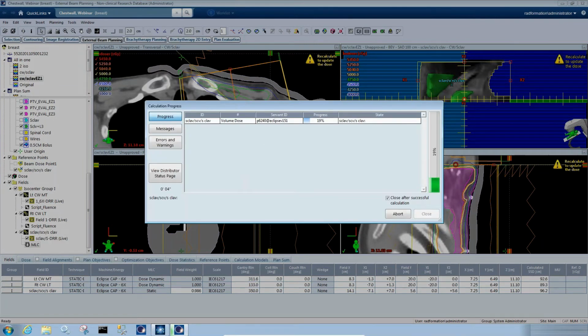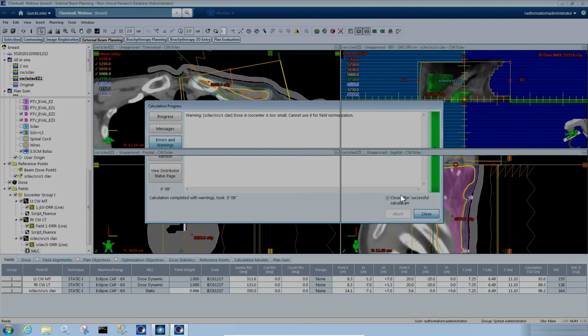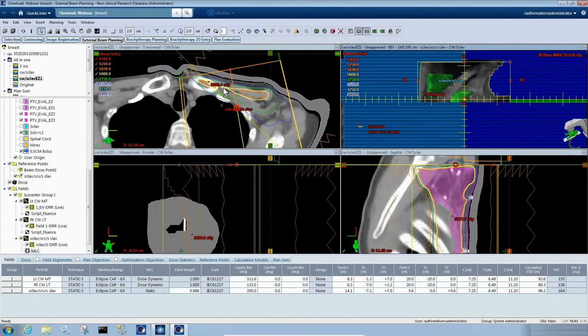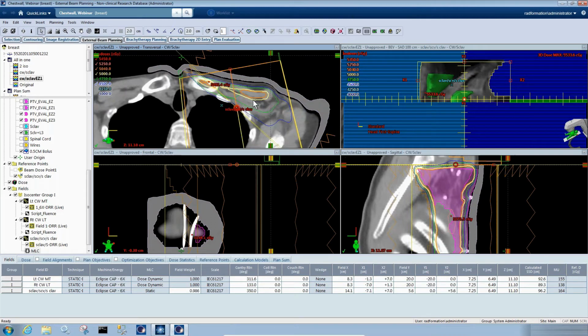Because they're open, you're getting almost 100% blockage through the MLCs and the blocks. But here we're allowing just a little bit of leakage. And I don't know if you saw, but this dose jumped up a little bit right here, about that 2% that we need to make a nice even dose distribution right at that match line.